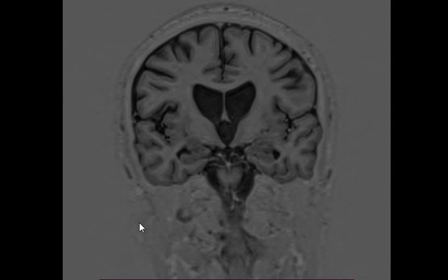I'm sorry, just brain atrophy, you mean? Yeah, sure, there are atrophic changes. I'm saying atrophic changes, meaning basal ganglia with cortex, for example. The cortical atrophy is useless. It will provide no diagnostic information for it. Right? There are like a trillion causes for cortical atrophy.